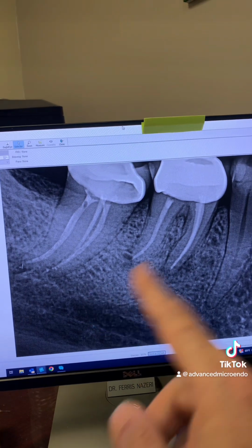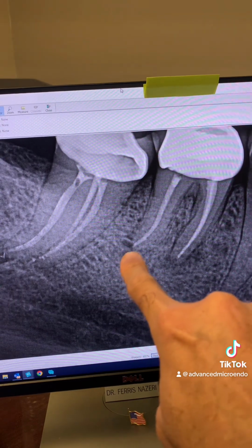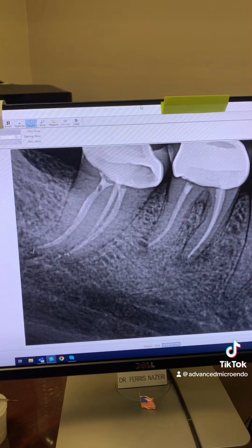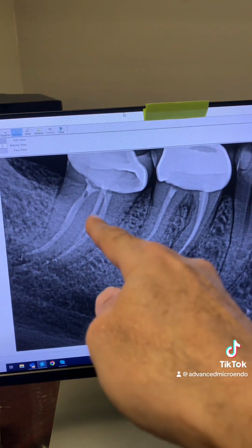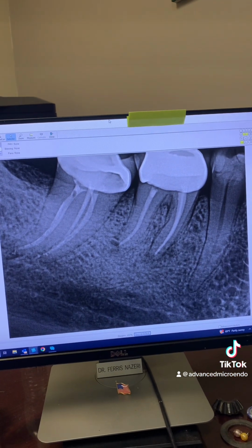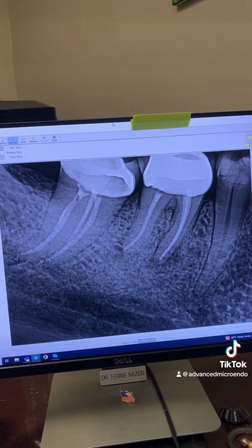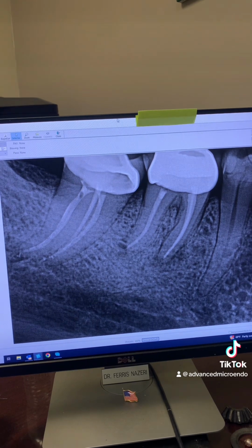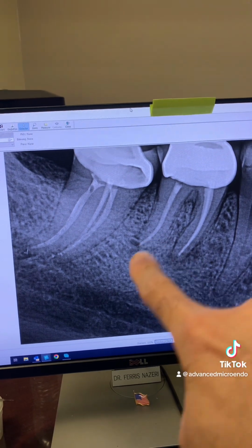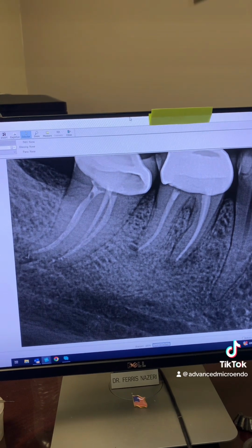We did these root canals in one appointment. And remember, tooth number 30, I had obturated a little bit on the longer side. Accidentally, gutta percha was sticking out. What happened to that gutta percha? It's gone. So 9 years post-op of tooth number 31, 8 years post-op of tooth number 30. One appointment. Root canal is as good, maybe even better than multiple appointments, as long as you can get the canals dry before obturation. The extent of gutta percha, the extent of obturation, does not have any effect on the outcome of the endodontic treatment.